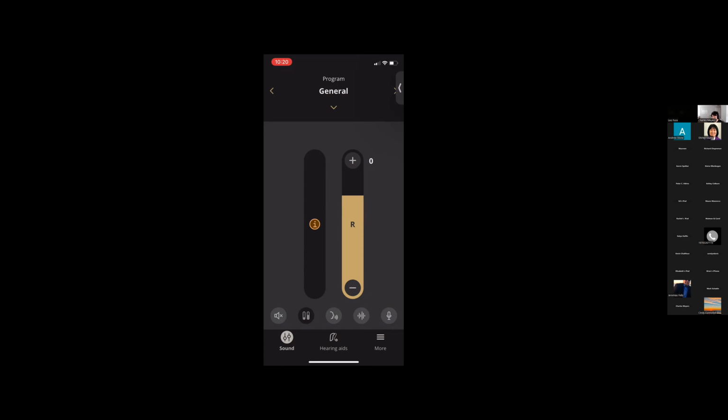So the next function on this row of buttons is a little confusing, because this button is to show you the two thick vertical lines that you can control the volume of your hearing aids with. So this button, much like the sound button at the bottom of the screen, the major categories, is already pressed when we are in the application. I don't know why it's an option.